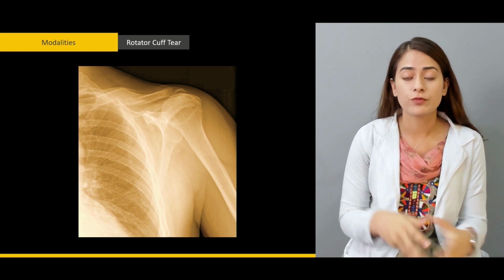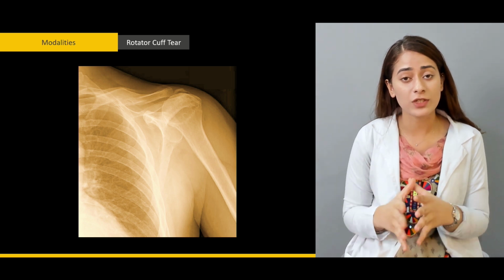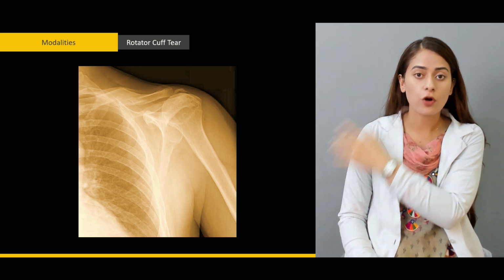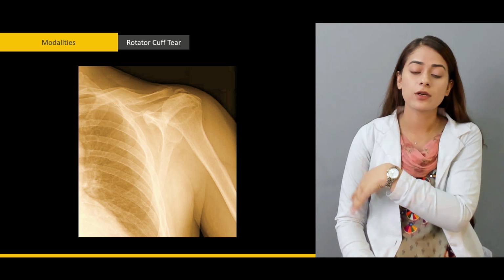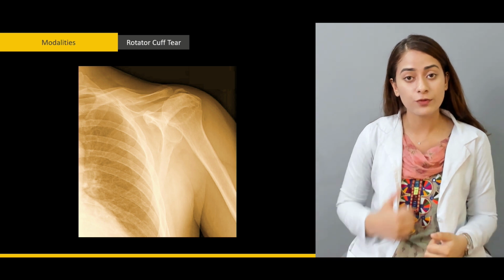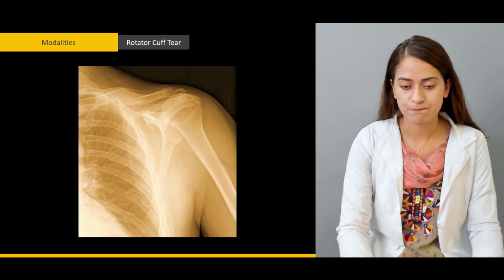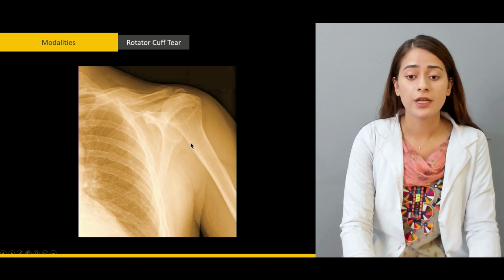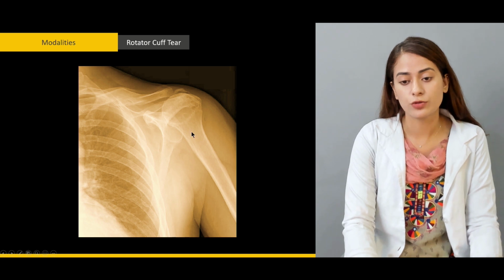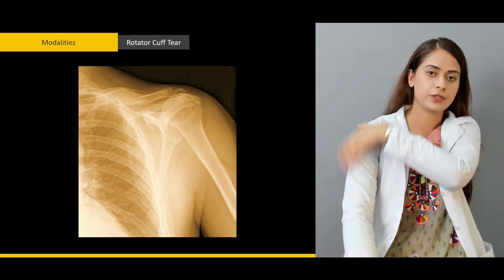So what happens with rotator cuff tear is there is a biomechanical imbalance. There is superior translation of the humerus on the glenoid, towards the clavicle or towards the head of an individual. This is because of the increase in the deltoid pull, and because obviously there is some tendon rupture. So this is what is visible here. There is excessive translation of the humerus superiorly in a diagonal direction, because obviously the deltoid is pulling it right here.